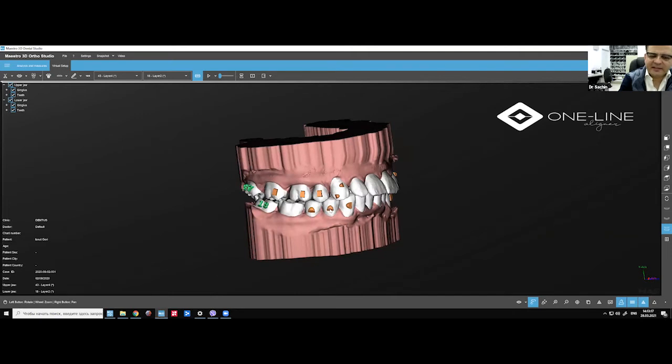The difference between these ones and the rectangular ones is the surface area on the lower side, because I would like sometimes to get some extrusion.